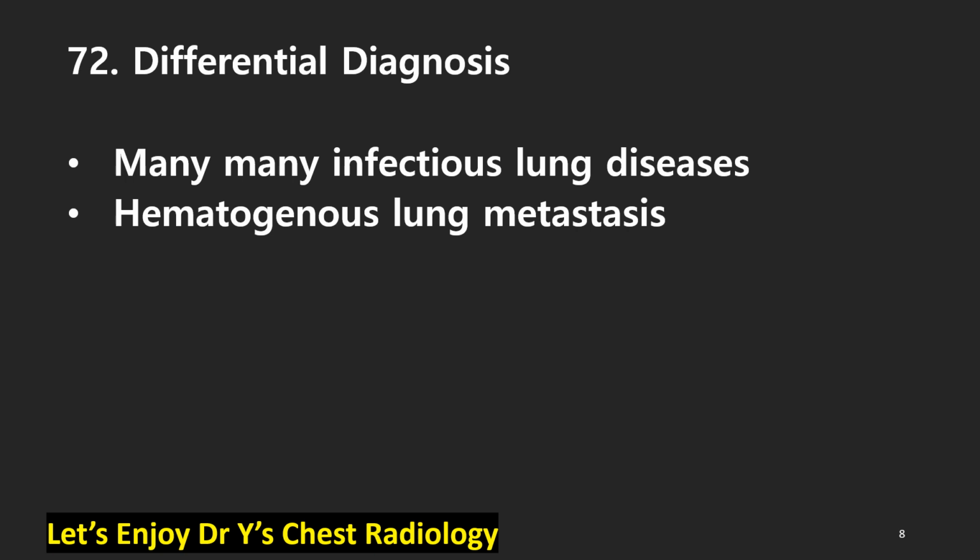Always we need differential diagnosis. Number 1 is many other infectious lung diseases. And second, hematogenous lung metastasis. Sometimes it's very hard to differentiate between lung metastasis and septic pulmonary embolism.